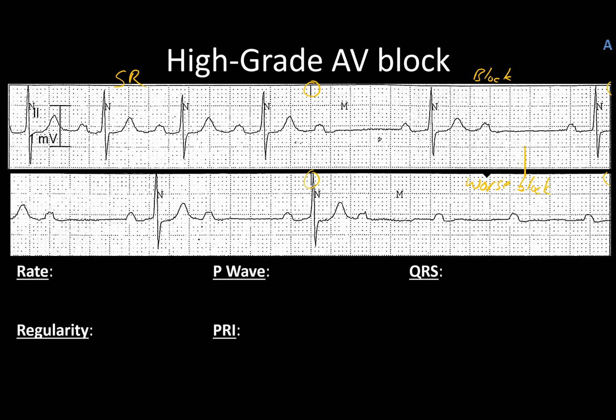Now I'm going to throw on the markings and we'll be able to tell a lot of what's going on. Start here.